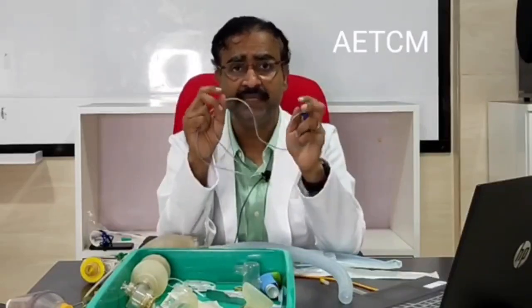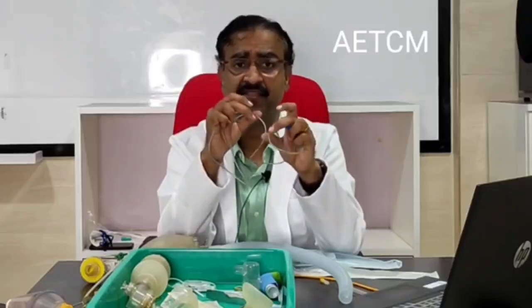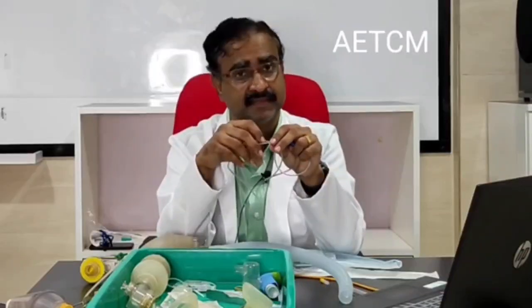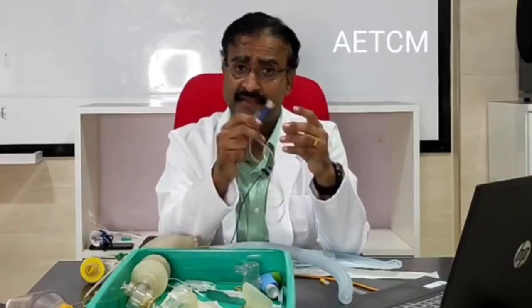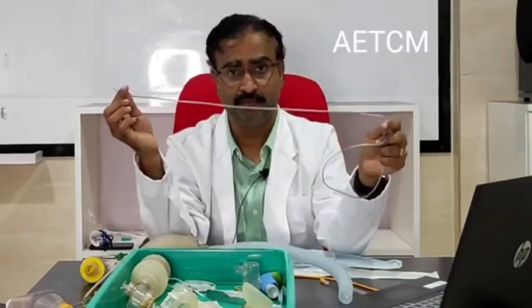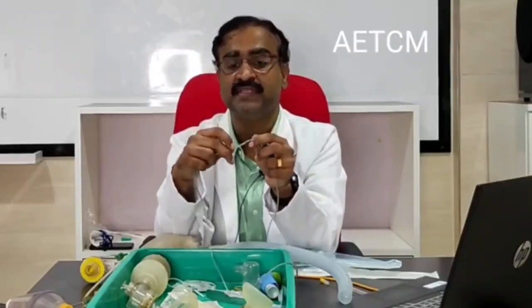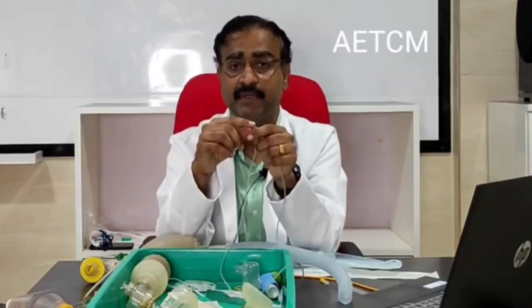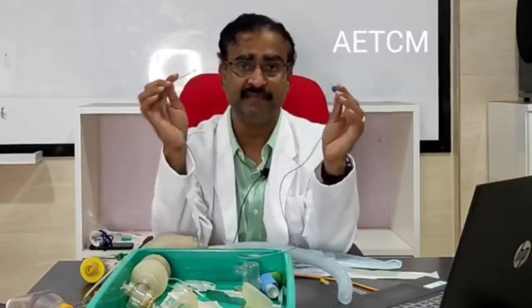So that means when you insert this tube, you can detect or see the extent of the tube that is inside the upper gastrointestinal tract. So this will help you in that matter. Like I said, how do you identify this tube? You have proximally a cap, and a lead line that runs throughout the entire length of the tube. The distal end is extremely soft, and you find bores on the side. You will not find a bore at the tip of the catheter. You will only find it on the side. So this is how you identify the tube.